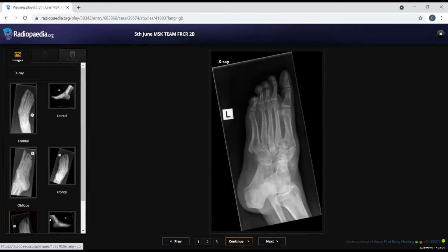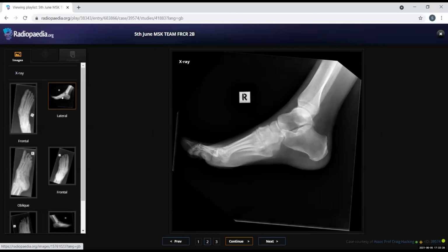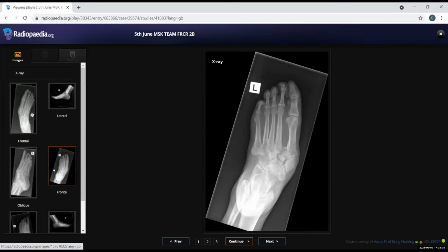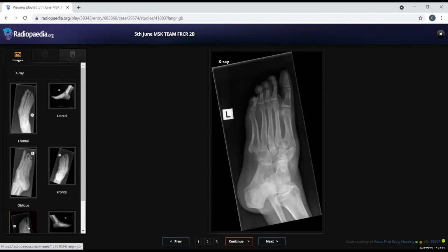There is no history of trauma. So there is laxity of the Lisfranc ligaments here, leading to lateral dislocation or subluxation of the tarsal joints, and on the left side it is divergent. The first one goes medial and the lateral four go laterally. So the patient has long metatarsal bones and laxity of the ligaments, and I think he's having Marfan syndrome. Arachnodactyly, no, sorry, not arachnodactyly.